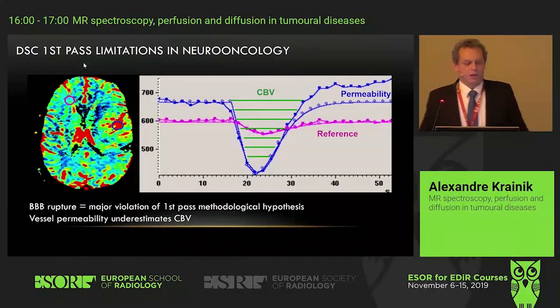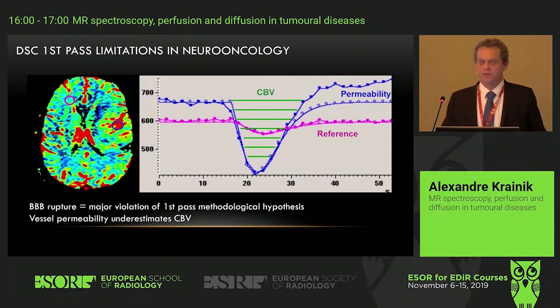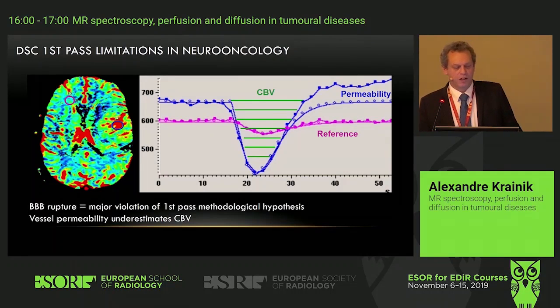Then how does it work? Again, here is a CBV map. You have a tumor in this area. Then you will try to estimate if there's an abnormal vascularization, an increase of vascularization. You won't take the CBV by itself, because the quantification of the cerebral blood volume and all these parameters, except the temporal parameters, all the volumic parameters, is not so reliable.